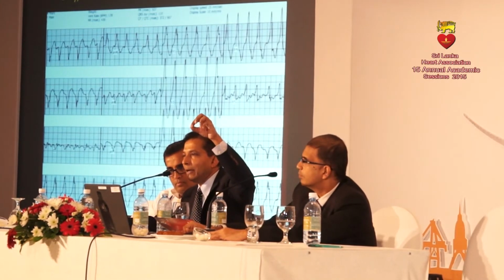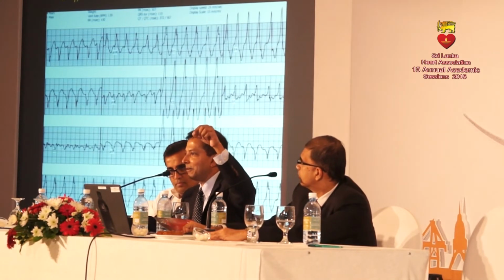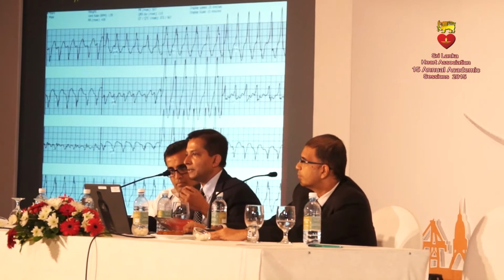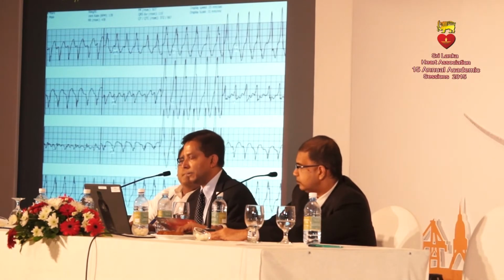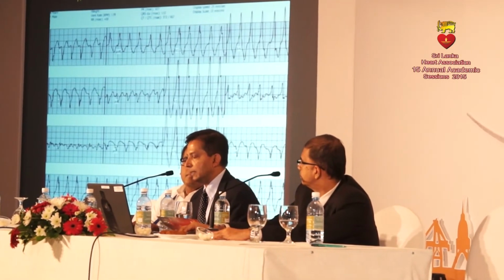So it's almost impossible to separate antidromic tachycardia from ventricular tachycardia because it activates from the ventricle up. The only way to know is obviously an ECG afterwards, like in this case. So statistically, almost always this is VT, but as Dr. Dunuwille proved, this is antidromic tachycardia.